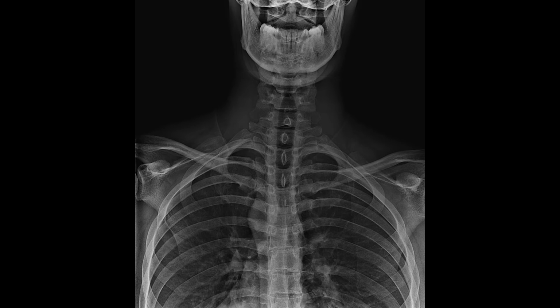And while I do hate this view, probably more than any other, this is a good example of one that's taken well on a high quality X-ray machine, and the image actually looks really clear and you can interpret most of it. So it is possible, but by far and away the majority of these x-rays that I see are absolute garbage. And if you really want to image the cervical spine, take dedicated cervical spine images. It's the best way to rule out osseous pathology.